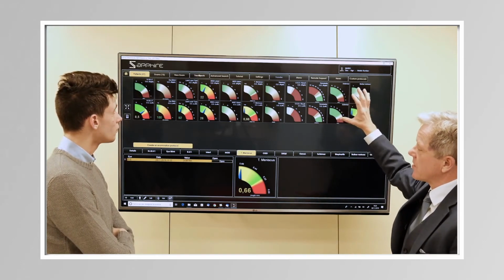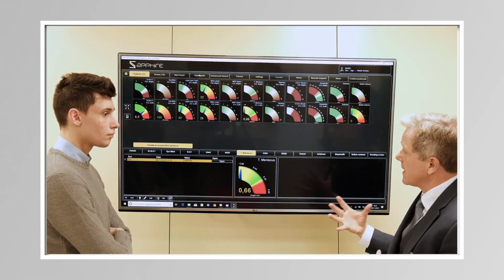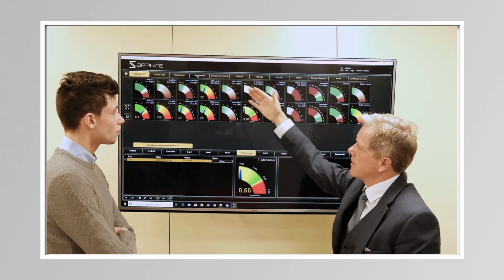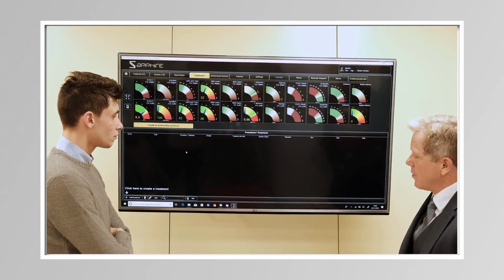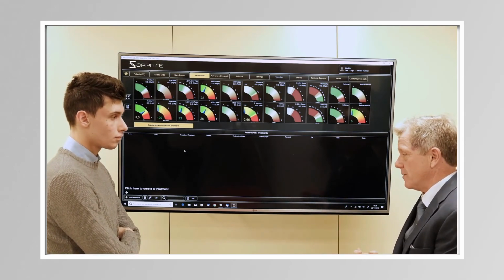So this gives us a great drop-down menu in terms of describing to yourself exactly what the condition of your eye is. If we said any of these were in the red, we could progress to a treatment option. The treatment option would give us a drop-down menu where we could create a prescribed treatment for you.